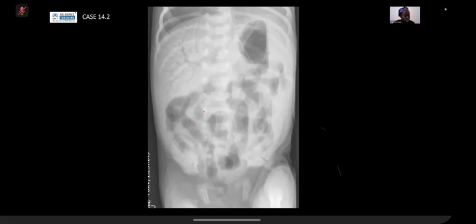If the patient had a UVC, umbilical venous catheter in, and I saw it was misplaced, like we saw in an earlier case where it was in the liver, and I saw portal venous gas, then I would more likely put that down to the misplaced UVC rather than necrotizing enterocolitis. But it's just an important point to have as a differential when you see portal venous gas. Is there a misplaced umbilical venous catheter?